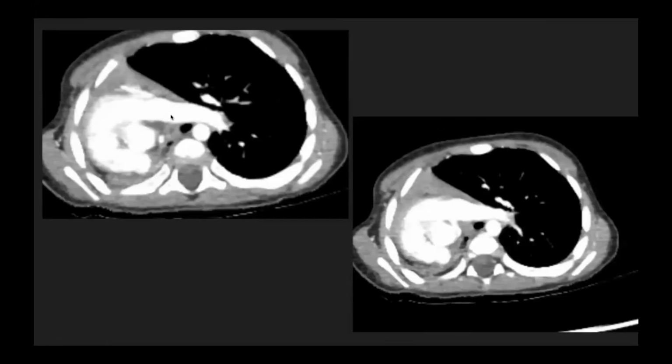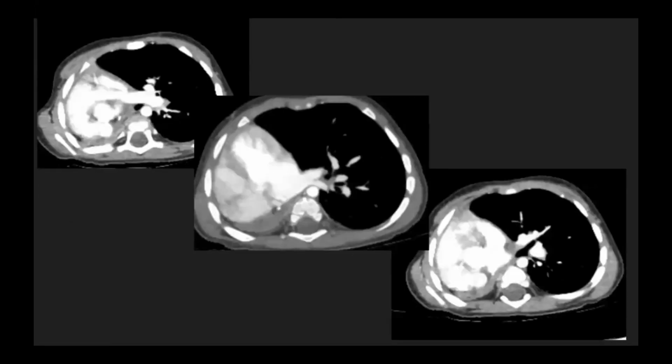So here, this is the left pulmonary artery. See, it has got a long course like this. Right pulmonary artery is not visible. But see carefully, is it really not visible? Yes, we can see a very tiny, very thin thread-like pulmonary artery arising, the right pulmonary artery. And it is going lower down into the posterior costophrenic sulcus. We can trace it, this dot.